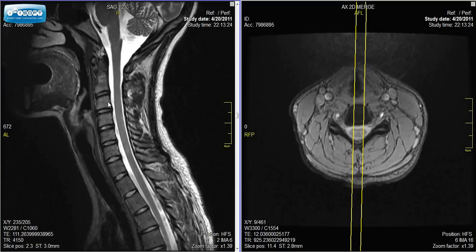Okay, Dr. Johnson, again here now reviewing an MRI scan of the cervical spine or the neck. Once again, we're going to use the PACS system, the computer-based imaging system that displays the digital data and gives us an ability to understand the three-dimensional anatomy of the spine and its contents by looking at simultaneous views that are orthogonal or in different planes.